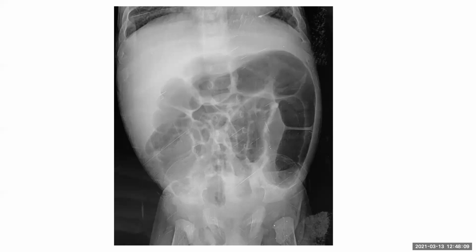Whenever you see a bowel that is obstructed, you would like to look for other things which would cause the obstruction. Usually the examiner will show you a film which will have the cause then and there for you to see.